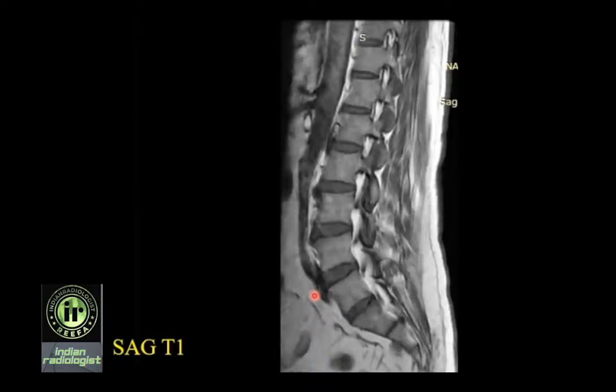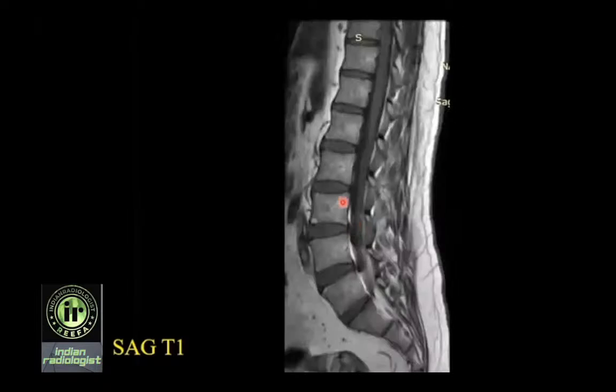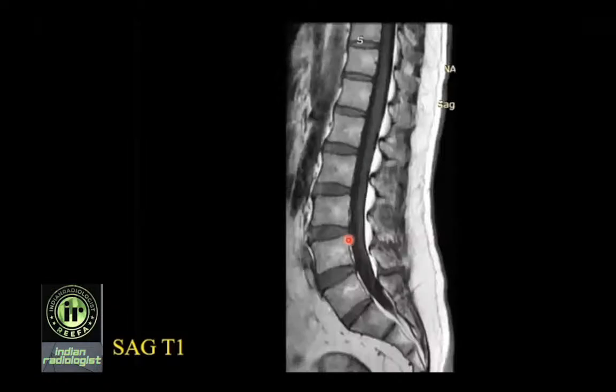Coming further medially, at the level of lateral recess, we see fat in the lateral recess. Because this patient's canal is nice and wide, you can see fat in the lateral recess very well. Coming into the paramedian section, you can start seeing the spinal cord and conus medullaris, a little bit of cauda equina nerve roots, anterior epidural fat, nucleus pulposus, annulus fibrosus. This is bang midline, vertebral bodies, nucleus pulposus, annulus fibrosus, conus medullaris, cauda equina nerve roots, posterior epidural fat, anterior margin of spinous processes. You measure your canal over here.